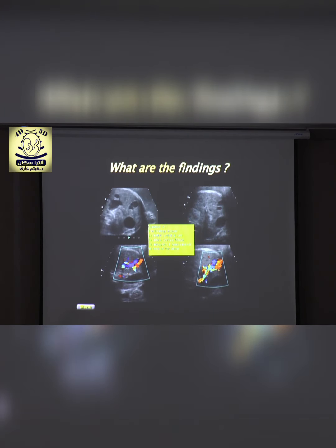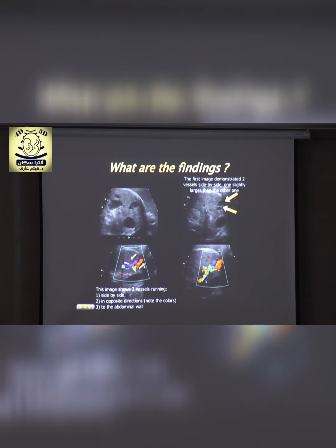So, is this a double umbilical vein? Yes, no? No, because they would be the same color. Is this an arteriovenous fistula with blood coming in one way, coming back the other way? Yes, no? It could be, but if it was an arteriovenous fistula, there would be a lot of venous drainage, and we don't see that, so probably not. Aneurysm of the vasa vasorum, that doesn't exist. None of the above. So we have 2 vessels, they go in opposite directions, and this is interesting.